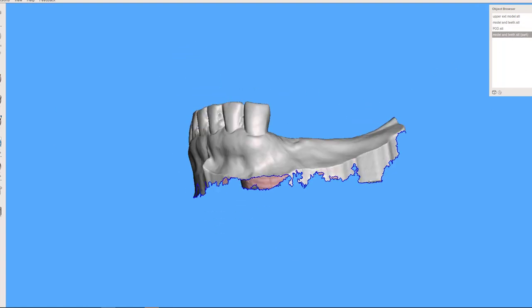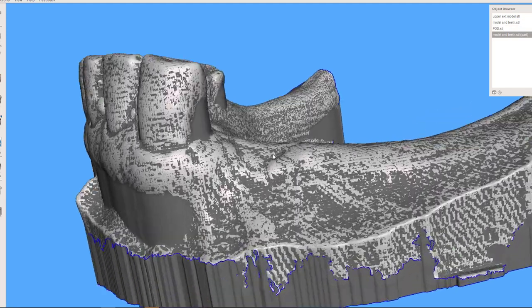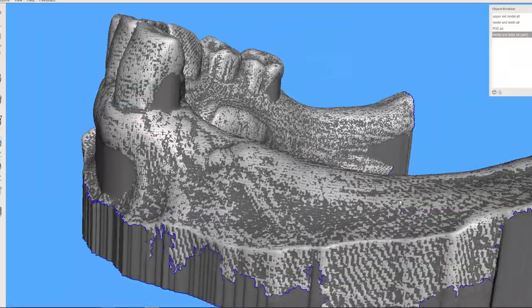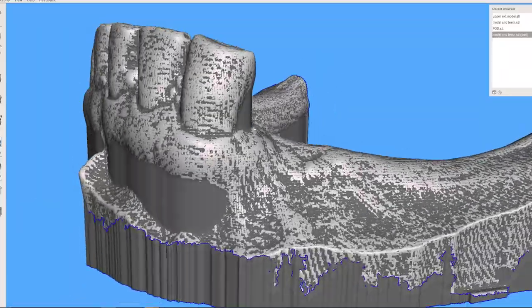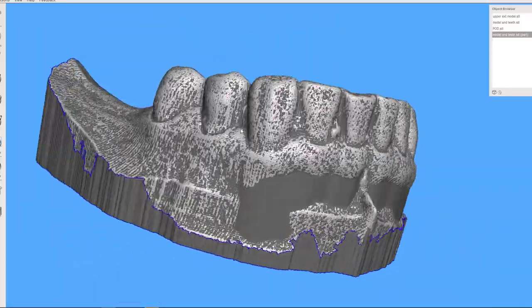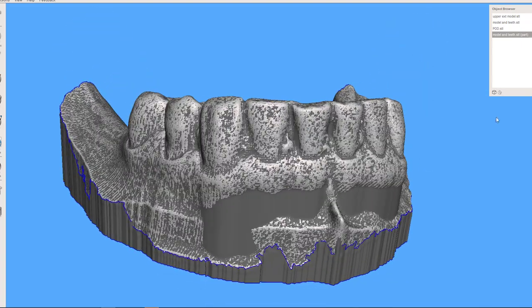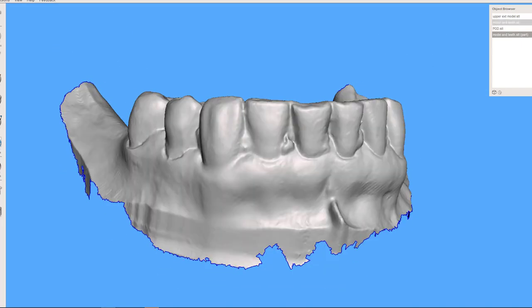We can turn the teeth off. But one of the things I just realized is that now if I turn on that path of draw model, I don't have to necessarily take those pictures I thought I might need because I can simply see now the areas that have been blocked out. Okay, so when I make this, I want to build it on the model that has excessive undercuts blocked out. Okay, so that in fact is what I'm going to do.